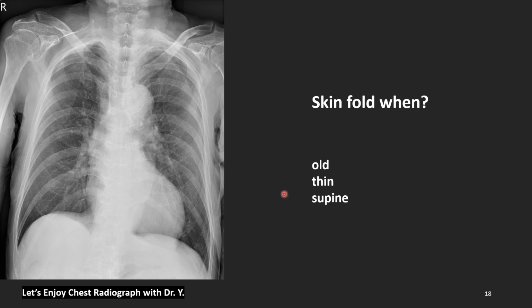And I suggest one idea: if you are not confident about the diagnosis of pneumothorax, take another radiograph immediately. Then more than 99% you can solve the problem, whether this is skin fold or pneumothorax.